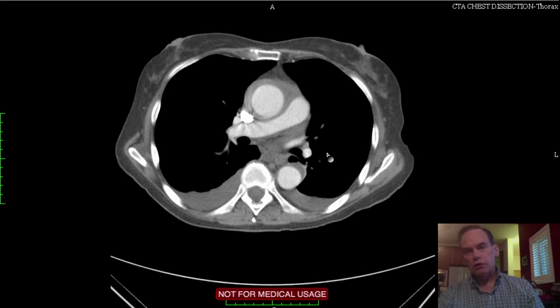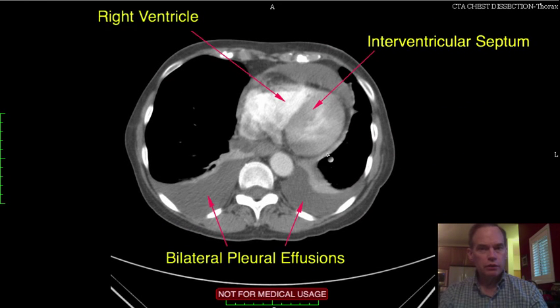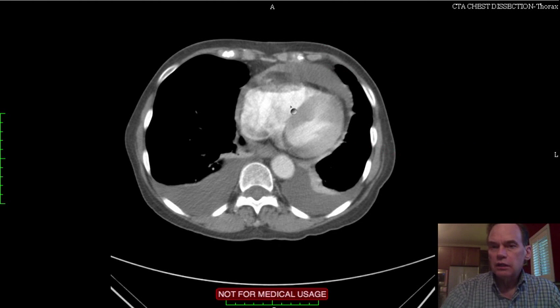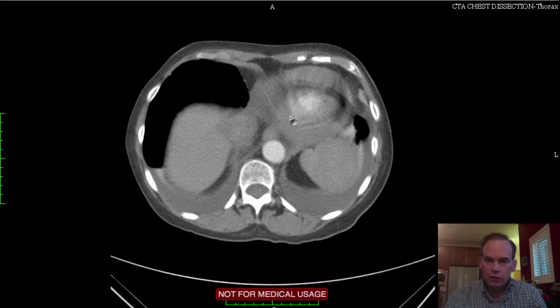And you can see that on a chest radiograph, lateral view actually. Okay, so this wall of the left ventricular cavity has an aspect which constitutes the division between right ventricle and left ventricle, and that is the interventricular septum. So while this is all part of left ventricular myocardium, this specific portion here, which is between the two chambers, is the interventricular septum, comprising a portion of the ventricular myocardium.